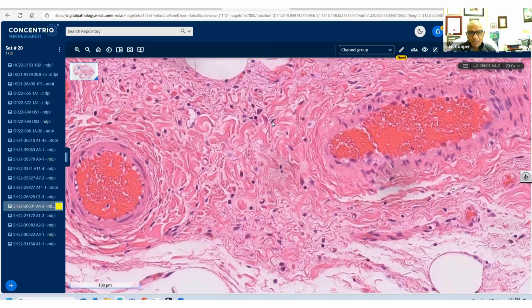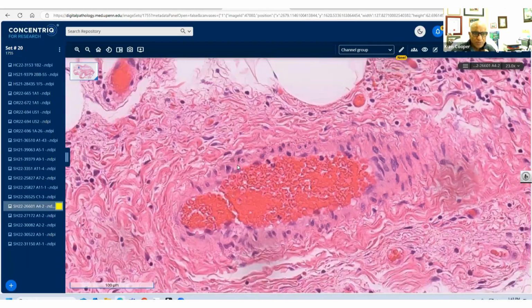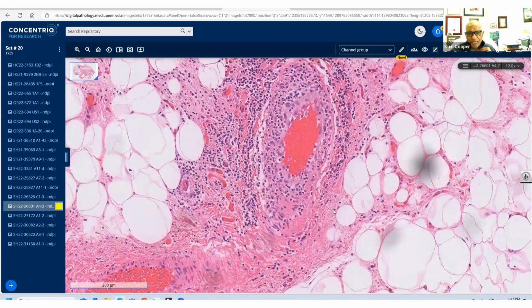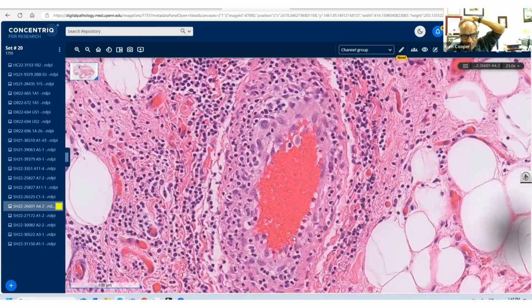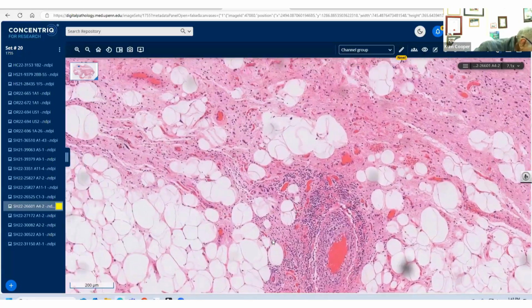Some of these may be endothelial, some of them may be atypical cells, but it's just a novel thing to talk about, really, when you go and find that. Here's more hyperchromasia. So again, just a nice well-differentiated liposarcoma, sclerosing type, hyperchromatic nucleus. Any comments, questions on that? No de-differentiation.